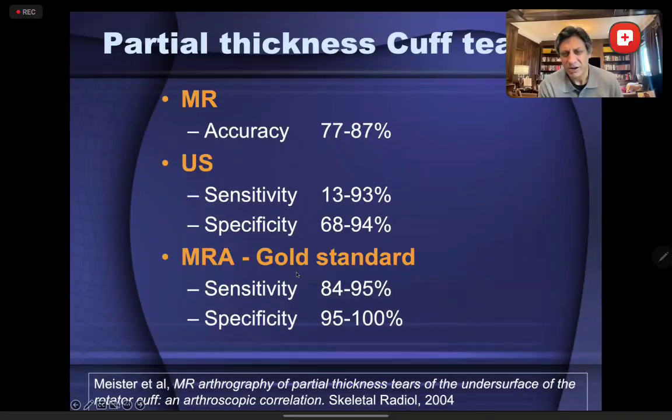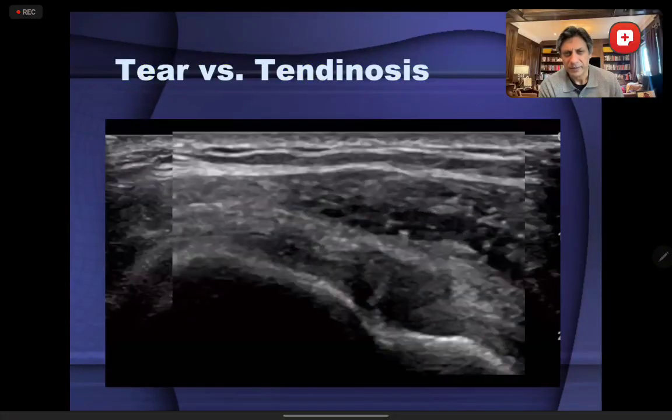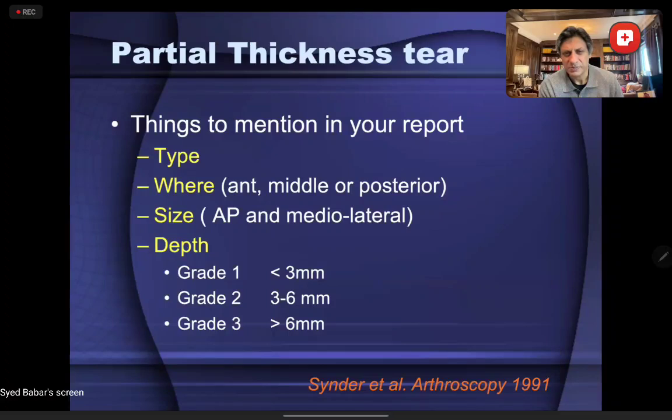Nobody does an MR arthrogram for picking up tears, but not a huge amount of difference between the accuracy of MR versus. So what I would mention in my report is this.